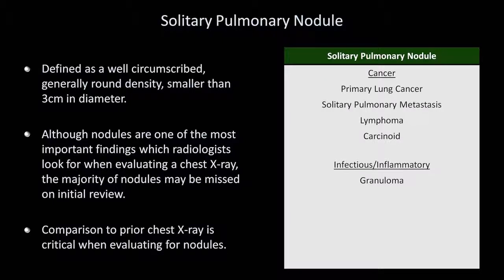Granulomas are generally believed to be responsible for the majority of benign nodules, which I've never personally understood since the infections which are classically described as leading to them are themselves relatively uncommon in this country. As we just saw with round pneumonia, these can present with an identical appearance. And there are some congenital etiologies such as an arteriovenous malformation and a bronchogenic cyst.